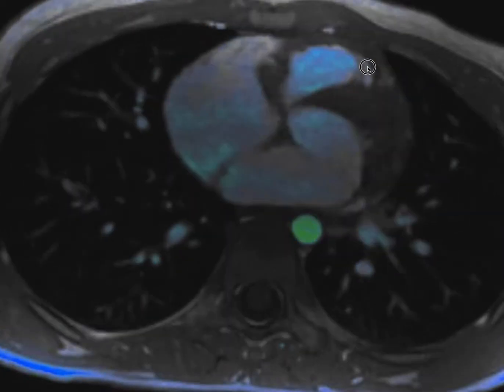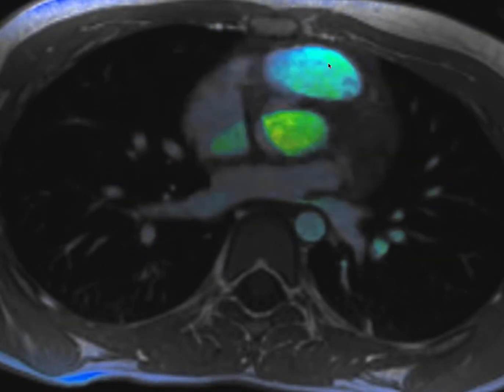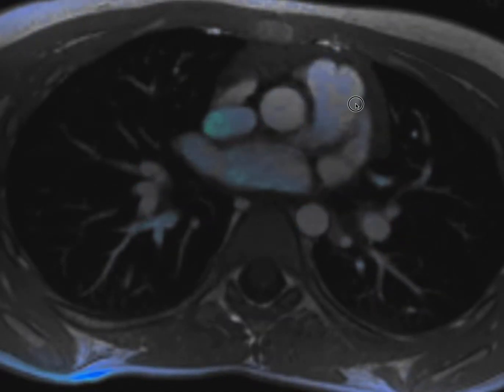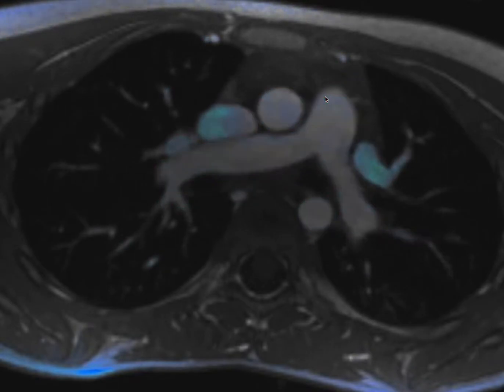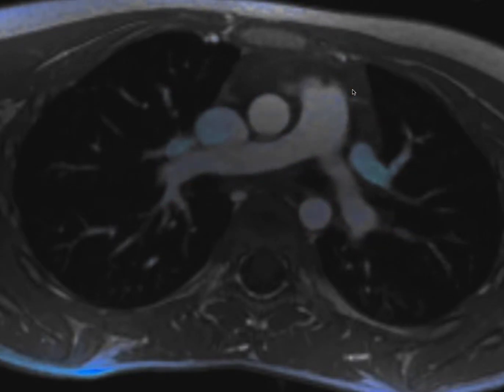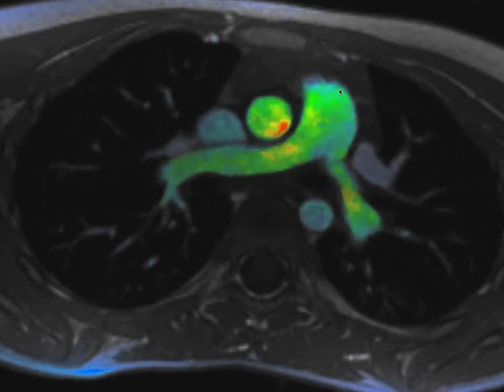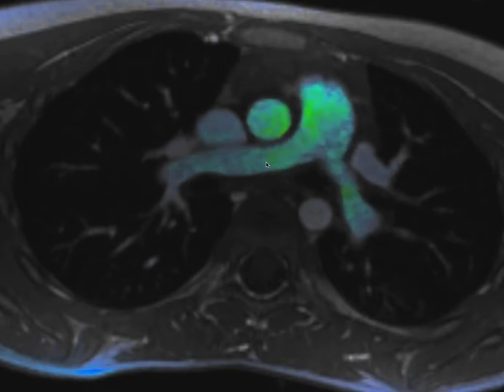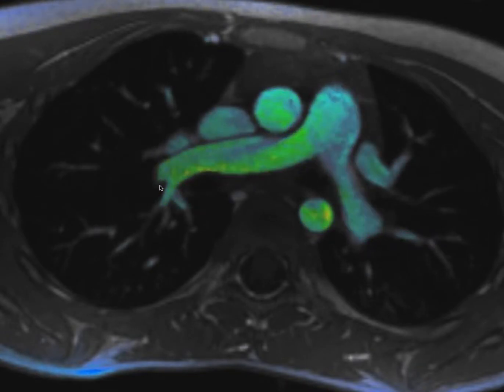Now as we follow this, we will see that the blood then comes up through the right ventricular outflow tract and is now heading into the pulmonary artery. So here's the pulmonary artery. You can see the blood coming out of it. Note that if the blood came from the vena cava, inferior and superior, it's deoxygenated blood. This deoxygenated blood went through the right heart, in particular right atrium, right ventricle, and is now going out the pulmonary artery to the right pulmonary artery and the left pulmonary artery. These go to the lungs.